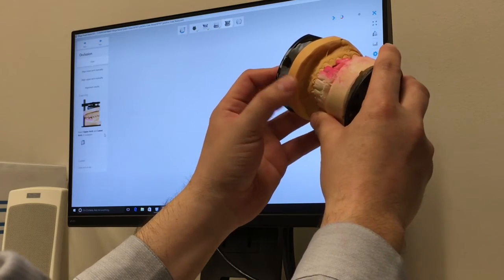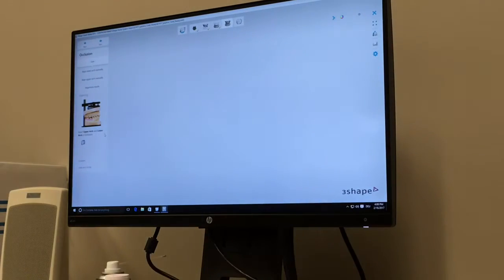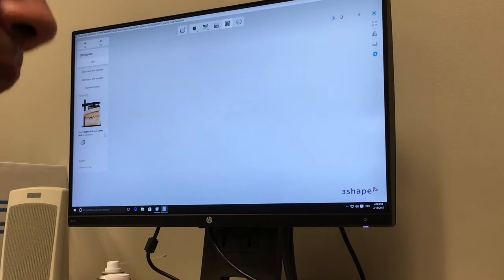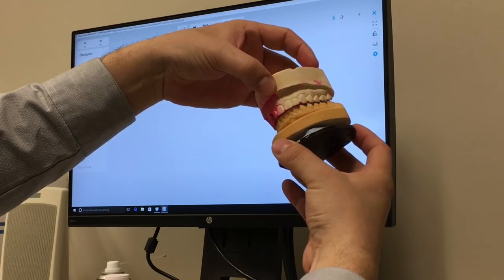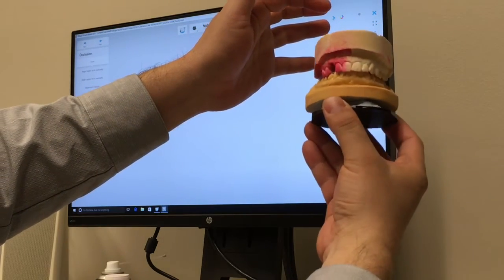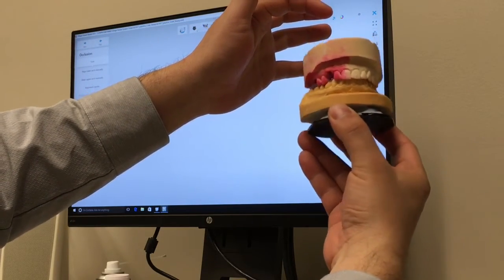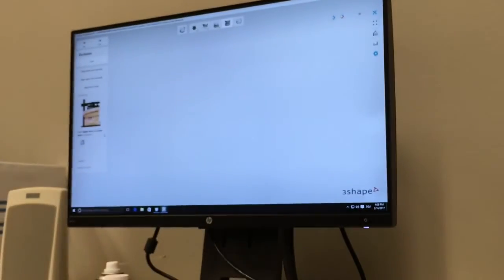If you really want accuracy, if you're doing a different kind of case and not an abutment case, and you really need for it to be perfect, then I suggest you do it off your articulator and then come back here, and now you have this really nice. Now you don't need any rubber bands. Okay, close.